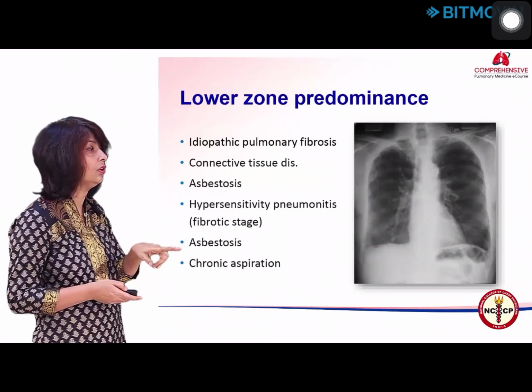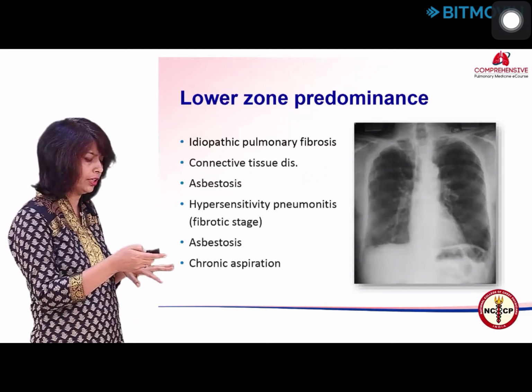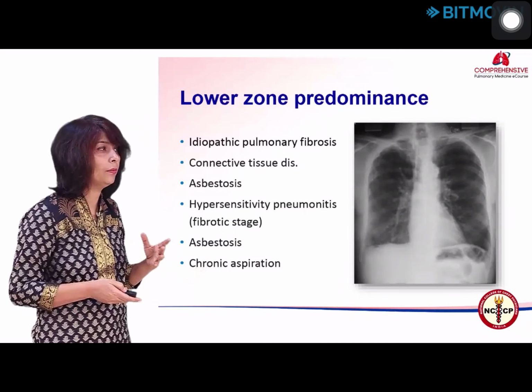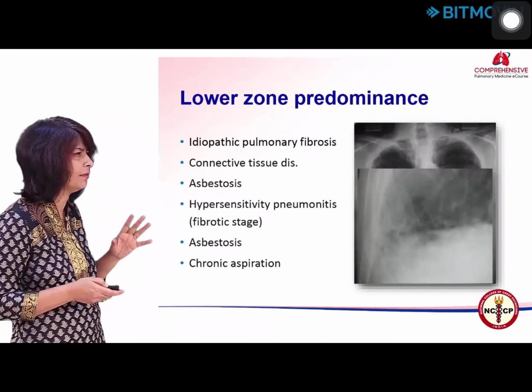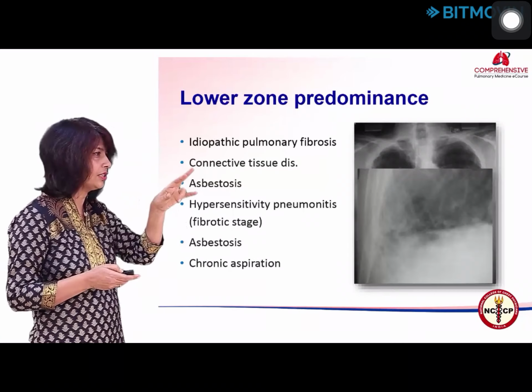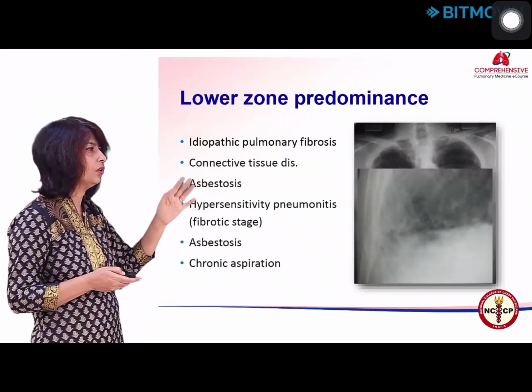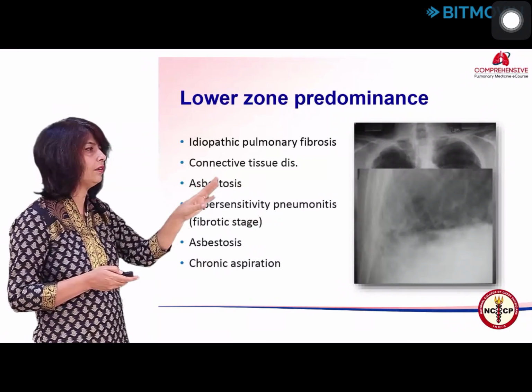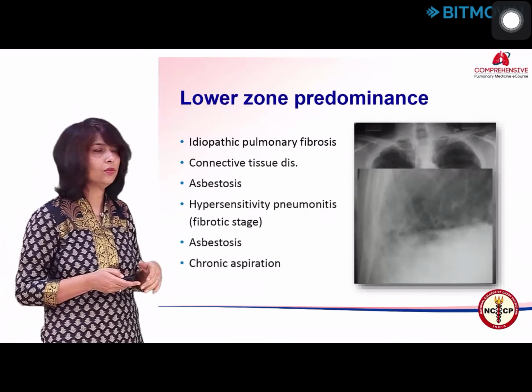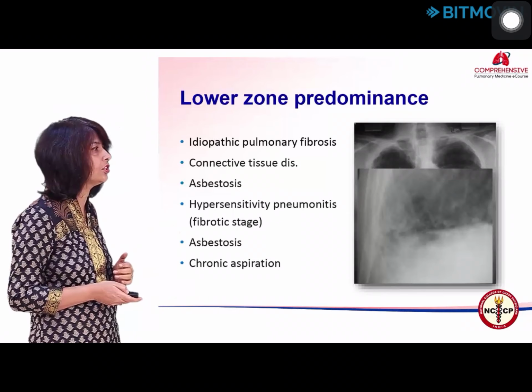CP angle is gone. Right side next to the diaphragm, you do have some reticular like opacities, and it's very nice for us now because we report almost nothing on films, so we can magnify and magnify, make it darker and lighter and see everything. So yes, I see the spider web. So appropriate age, smoker, I see lower zone dominant, reticular pattern, I would label it as idiopathic pulmonary fibrosis, a UIP pattern. So that's how the pattern plus the location helps you.